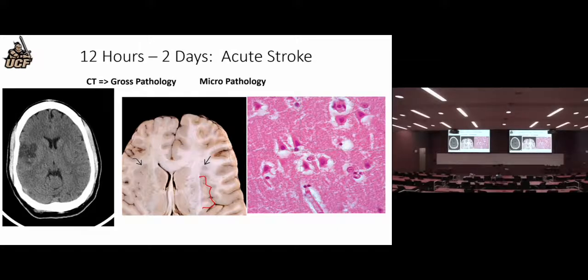Here's the gross pathology. Actually, I think this one is actually flipped around. Here, this one is on the right side of the brain, and the abnormality is marked on this side of the brain, but really this looks pretty subtle. If you look here, you look here, there's not much of a difference. We can ask Dr. Hussein about that one when he comes back. I'm honestly not too impressed by that slide. But anyway, here's the neurons.